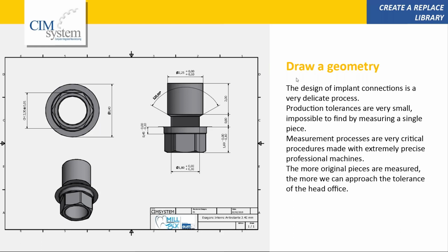Another point, MillBox Implant Editor is a very powerful tool, but to design the connection properly, you have to know different points.